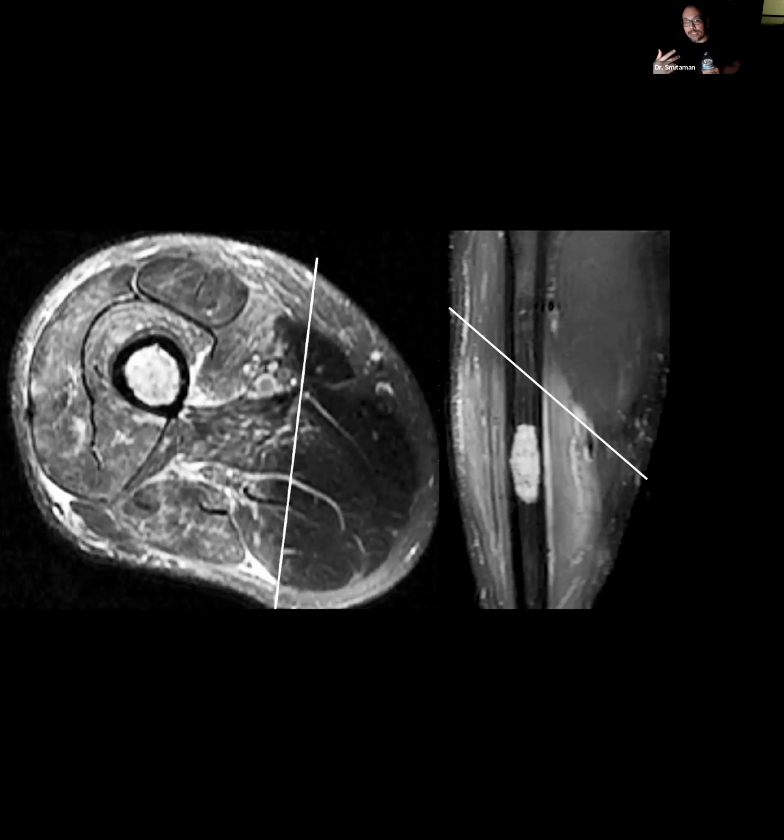Unfortunately, as we are able to keep patients alive longer with more comorbidities, you may see what's called radiation recall, where you get a reactivation of the previous radiation site from a secondary chemotherapeutic agent given to the patient. That's something to think about. But again, you're looking for that sharp demarcation from the previous radiation field. Talk to your radiation oncologist, figure out where the radiation portal was, and that can help you, especially for patients, and avoid potential biopsy.